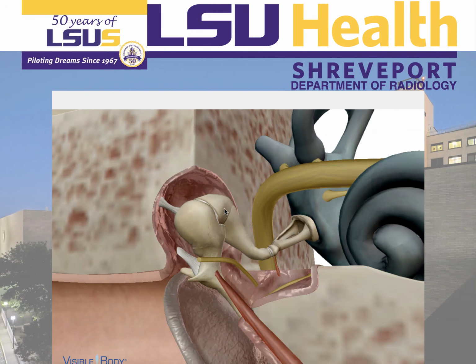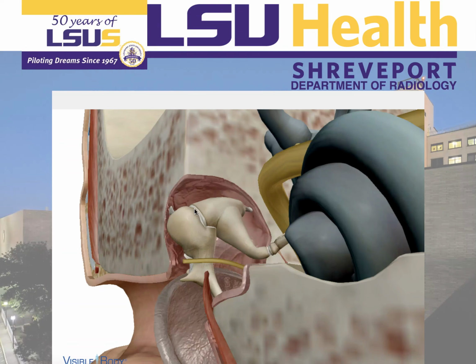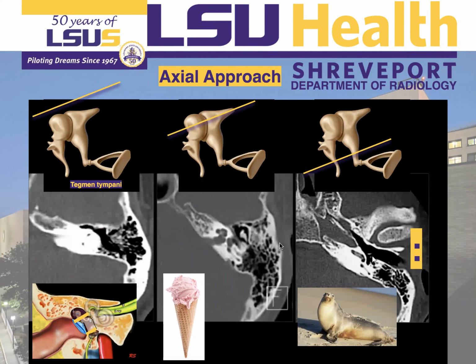Here is the incus, incudomalleolar joint, body of the incus, short process of the incus, long process of the incus, lenticular process of the incus, attaching through this incudostapedial joint to the stapes. Here is the head of the stapes and the crura. Okay, so this was a very quick review about the anatomy.